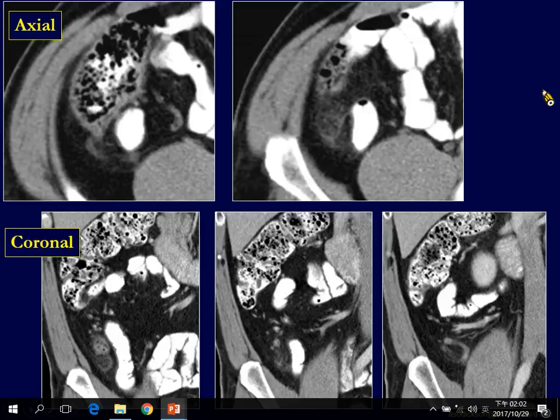The reason I show this is because you can also see this down closer to the appendix. Another of my favorite cases here. Here we see some inflammation in the right lower quadrant. So our resident at the time said inflammation down by the cecum, this must be appendicitis. The patient gets put in a wheelchair to go down to the operating room.